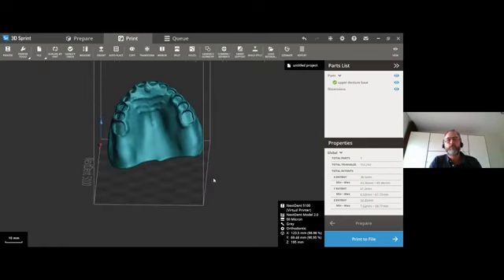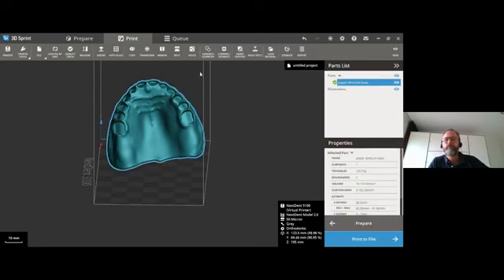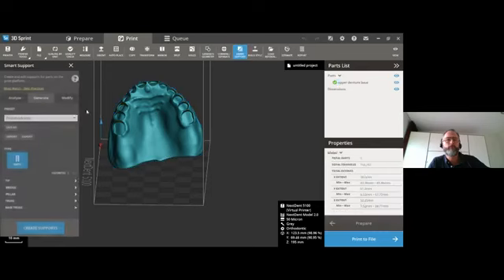Now, one more thing that we would like to point out. There are some question marks here and there in the software. If I'm not mistaken, of course, they will get you to a help page from 3D Systems. Menno, maybe a short message on that? We have 2 options here, very important. If you are a beginner, but also if you are more expert, then we have the question mark.